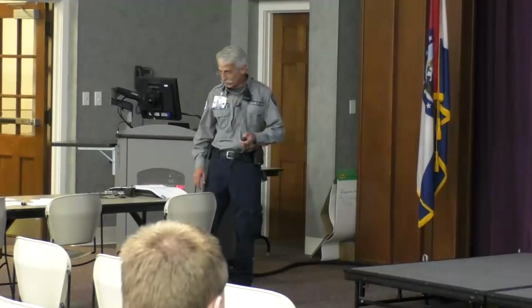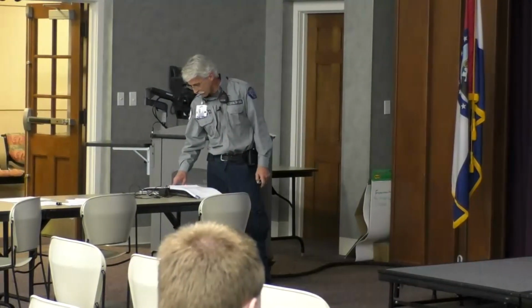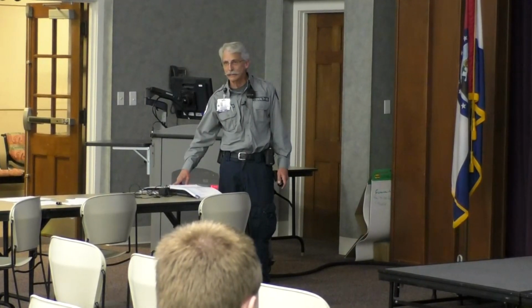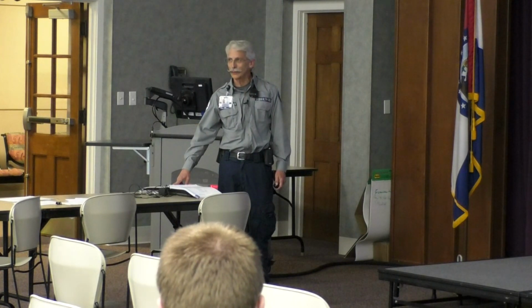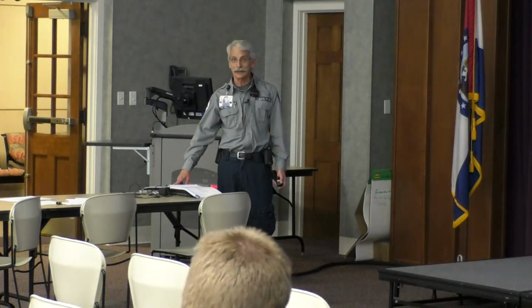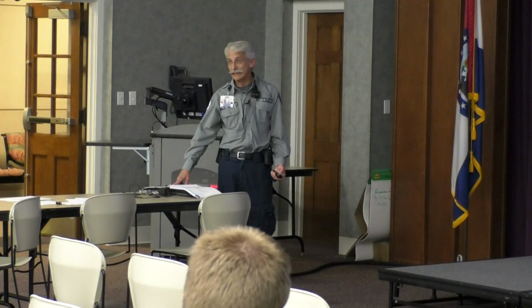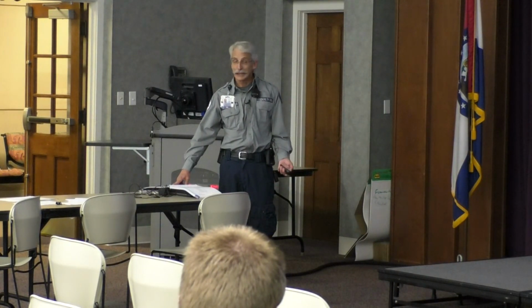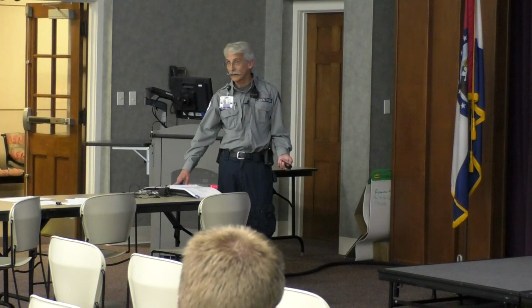So we're not seeing a whole lot there, are we? Is there any ST elevation, any depression? No. Got a sinus rhythm. There's a slight Brady. Do I need to fix that Brady? Thank you for asking the question. What's the blood pressure? What's the rest of their vitals? Because if they constantly have an 80 for a heart rate and this is way too low for them, I might have to. It would be rare that I have to do that, but I might. So you need to assess your patient before you make those kinds of decisions.